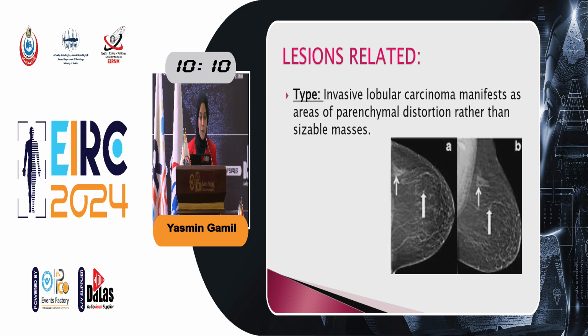The type of breast cancer is related also to the factors of underdiagnosis, as invasive lobular carcinoma manifests as areas of parenchymal distortion rather than sizable masses, as shown in the mammogram.